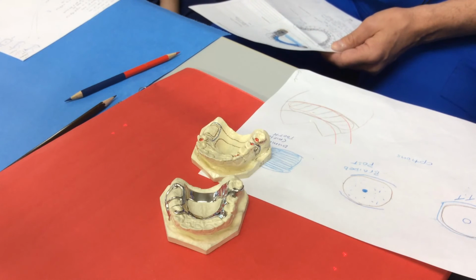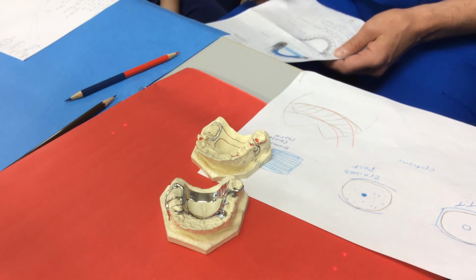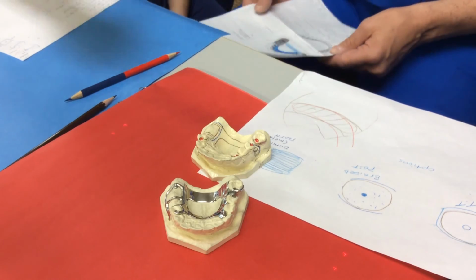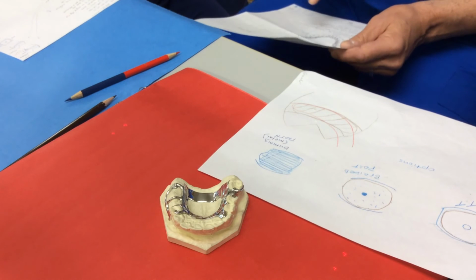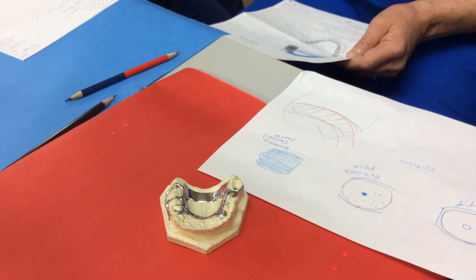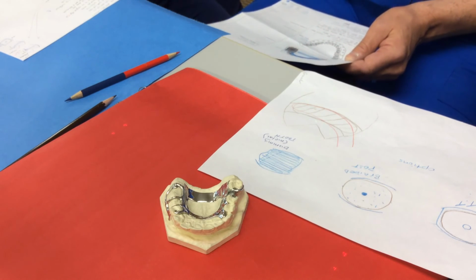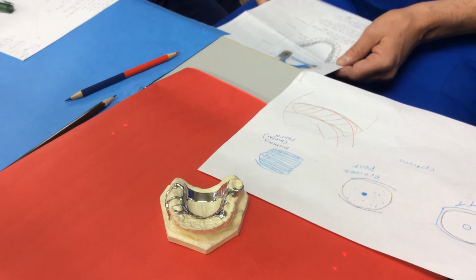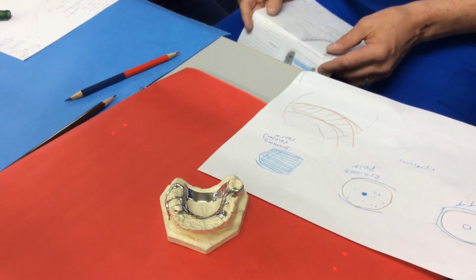It's not a guide plate because it's not interproximal. It's not a rest, and it's not acrylic retention. So you really can't put it any place. If I was going to indicate the plate, what I might put under design alternatives is reciprocating clasp arm instead of plate. I might use that as one of my alternatives. But otherwise it just comes from the drawing.